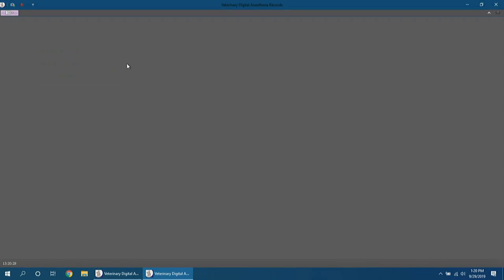That concludes our first time setup of the software, allowing one to customize VetDAR to their individual needs. We'll now close the program.